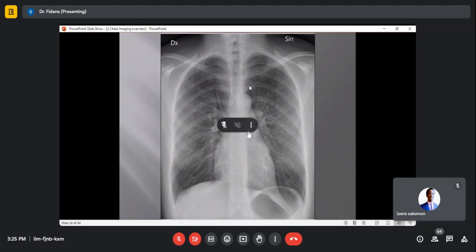There are 7. Who said there are 7? Listen, this is number one, okay? 2, 3, 4, 5, 6. How can you count this? And remember, the condition is you should count the ones crossing this clavicular line; above that is not counted.